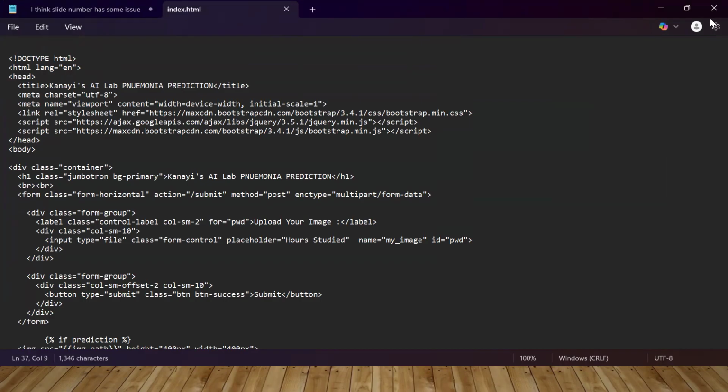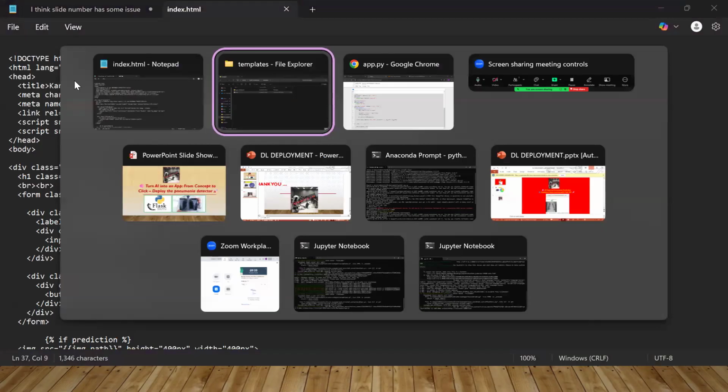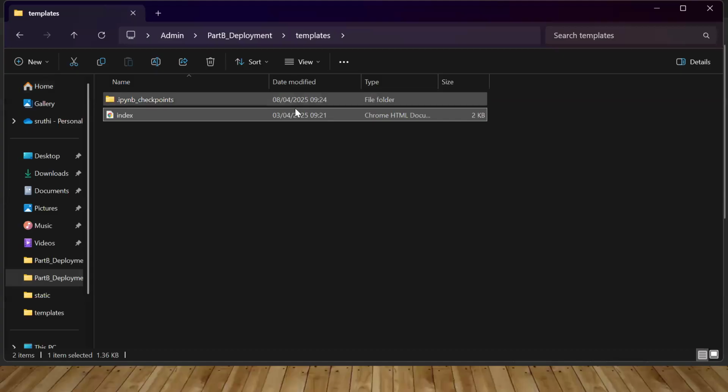It's a simple and responsive Bootstrap-based page connecting to Flask to handle user input and display the output returned by the model. This is all the styling part. We have a title here and templating, fonts, etc. With that understanding, we will move on to how we can run a prediction using this complete setup.